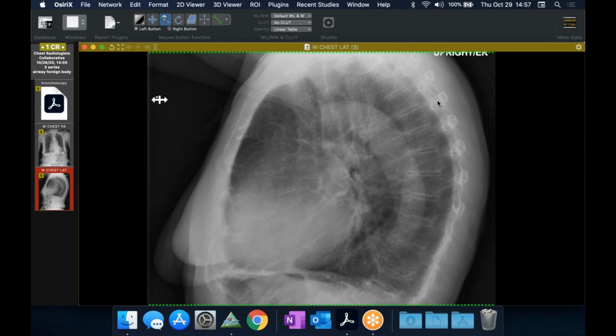Very interesting. It was a fun one and easy. It's interesting that your esophagus is a bit dilated, maybe more than just a little bit, with air in its lower half at least. Oh yeah, I was trying to determine whether there's a hernia there or something, whether she has something with her esophagus that might have contributed to the aspiration of it in the airway. I don't know, of course. Yeah, I think she was in her 90s, so there are high rates of esophageal dysmotility in that population. And her heart's a little generous too, so who knows if that happened. But those pills are pretty big, so easy to aspirate.